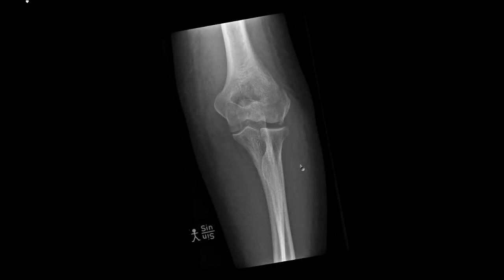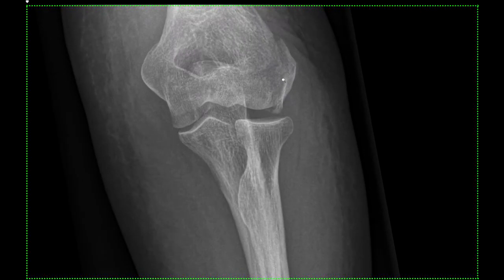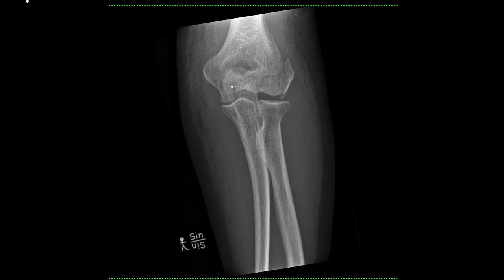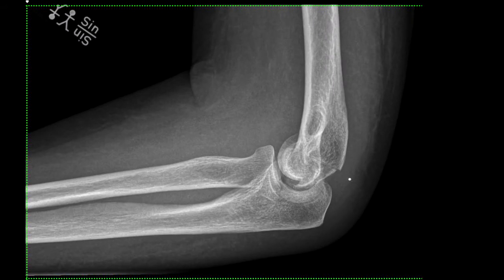Here's another big one, guys. There's clearly some fracture here, and it's going like this. You don't know exactly the extent of it. You try to follow the cortex really carefully, and it's going here as well. You see that beautifully. The clinicians wanted to see the extent of the whole fracture, so they did a CT, and I want to show you what they found there.